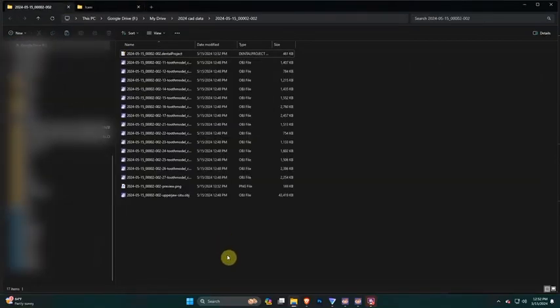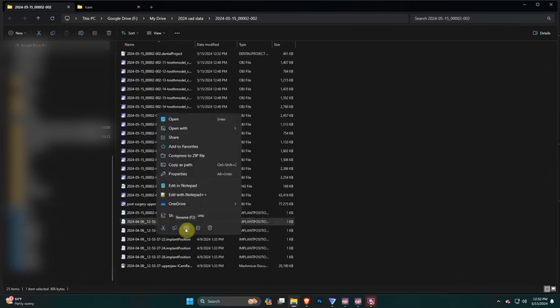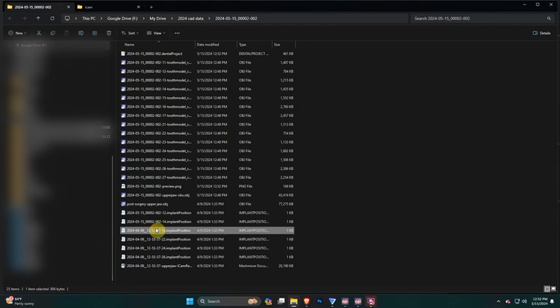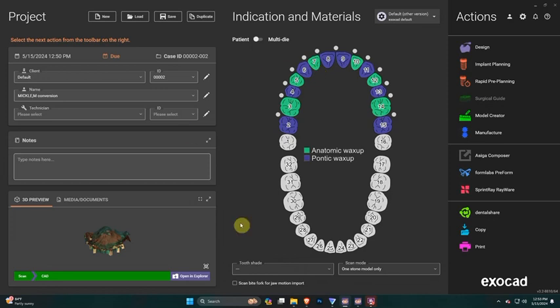And now we're going to bring in our iCam data, which is our implant position files, and our post-surgery scan, which were matched up in the iCam software. And now we're just renaming it with the project tag for this project so that exocad knows to read these as part of this project. Once we get all those renamed, we're going to take the post-surgery scan and call it upper jaw. We're going to save it. Everything's lined up. We're going to jump into design.